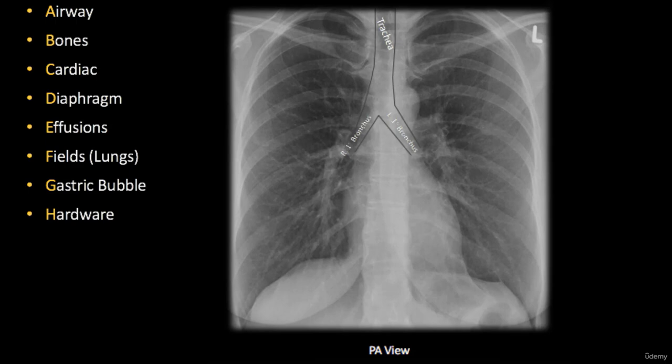The trachea is a vertical line closer to the midline. It is filled with air. That's why it is radiolucent and appears darker on the X-rays. The carina and two main bronchi appear below the level of T4. The X-ray of the thorax is useful when you need to evaluate the placement of the tracheal tube. Is it in place or not? Or when the patient has some foreign objects in the bronchi.